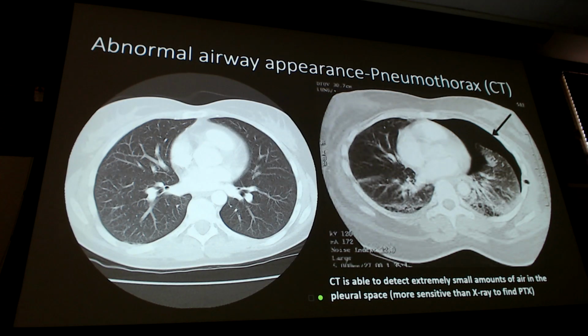Here's what a pneumothorax looks like on CT. Okay. So now you can see here why CT would be basically a study of choice, because look at how well it stands out against the thorax wall, and you can really see that lung tissue. So even if I had an itty bitty pneumothorax right here, I would see that nice black circle, or that nice little black area on the CT that maybe I can't pull on an x-ray. So this is why we'll do a CT as a study of choice. We don't do them often for pneumothoraces, because a lot of them can be seen on x-ray, or when they get bad enough, we just treat it as a tension when it comes in.